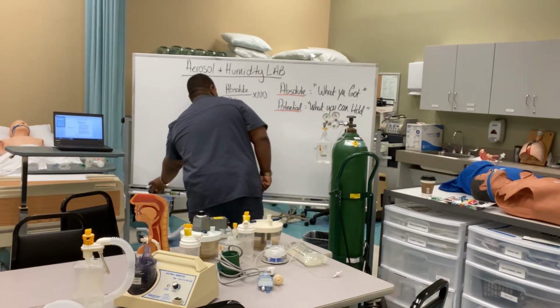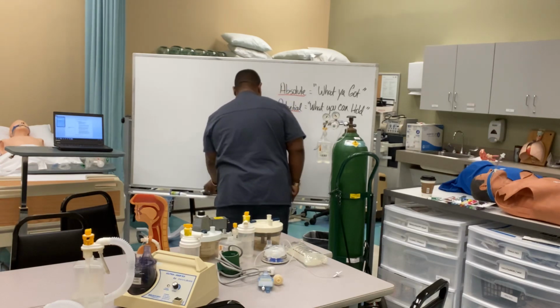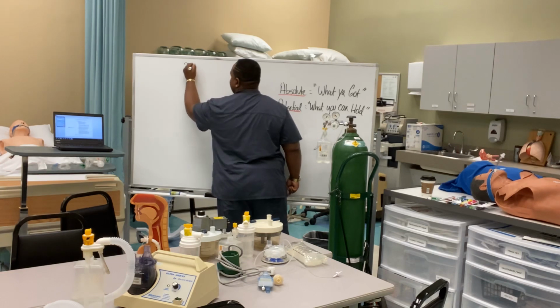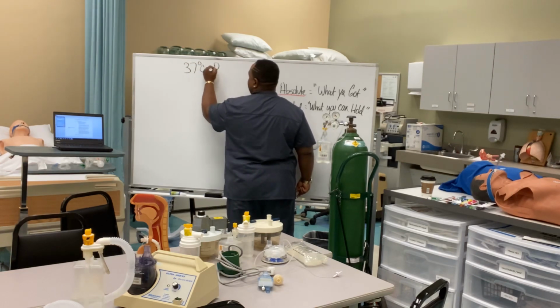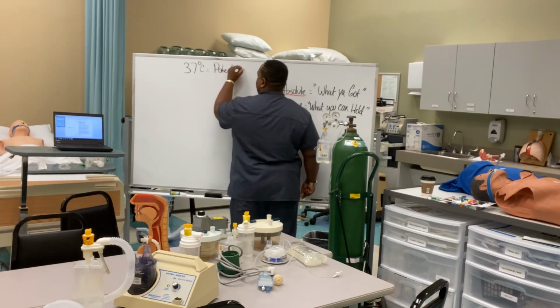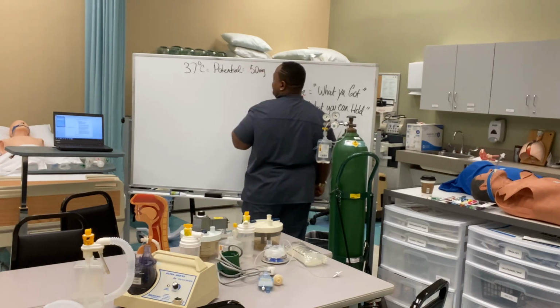If I have, let me get rid of some of this. If I have at 37 degrees Celsius, I have a potential of, let's just say, 50 milligrams of water, right?